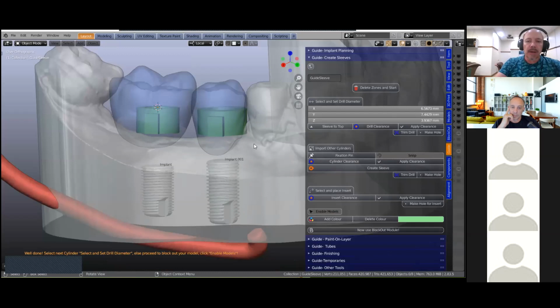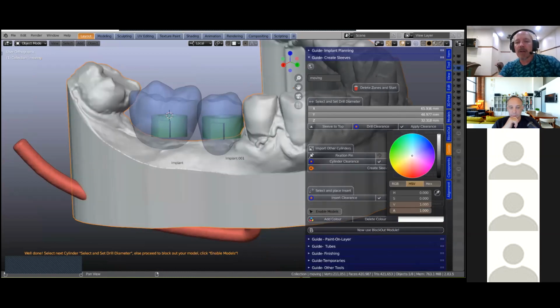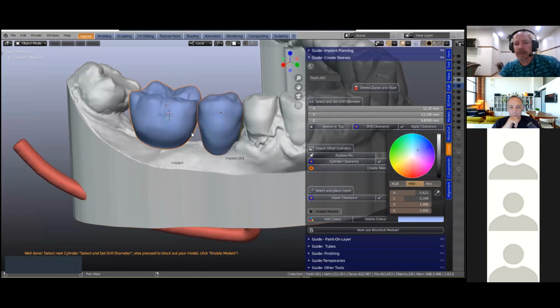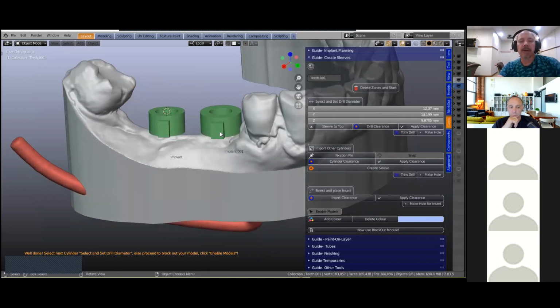All right, so now we're ready to make the guide. So we're going to be closing the section as well. I will give it a bit more alpha value so we can actually see what is going on here. Yeah. So these two, I'll just click hide for now.